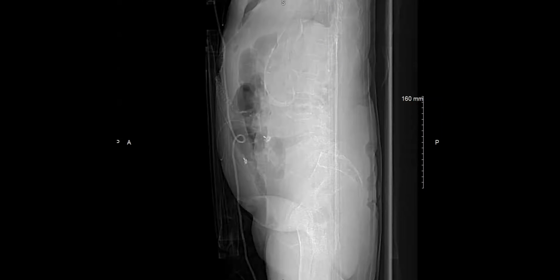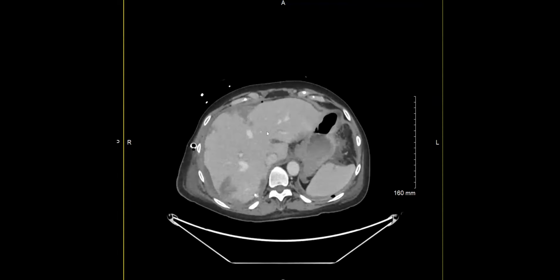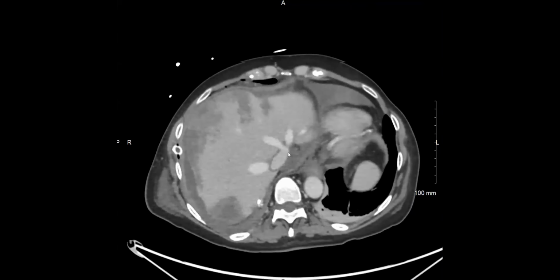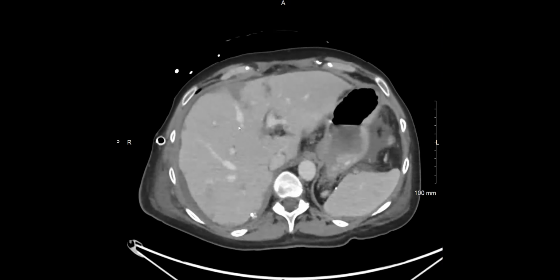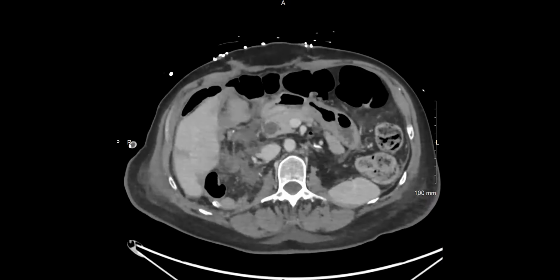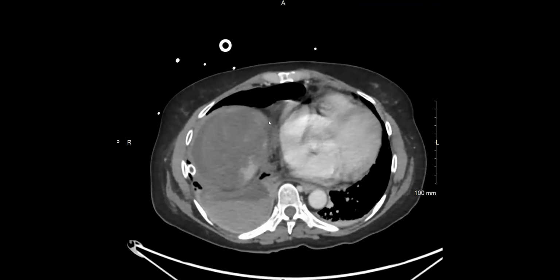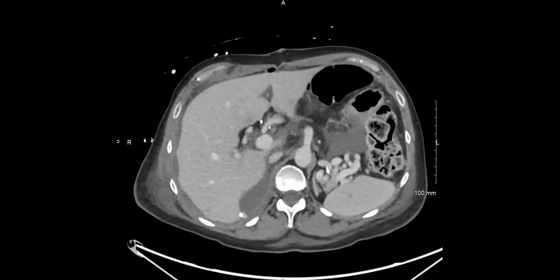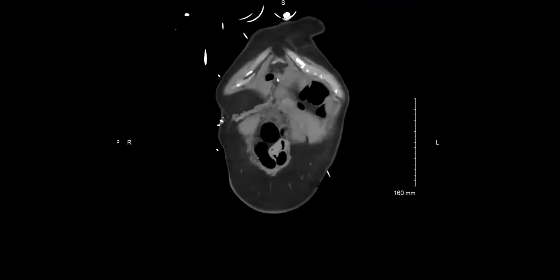Okay, cool. All right, so this is a patient who just had a liver transplant and is in the SICU, presenting with a rising lactate. And this is the scan. It's not a diagnostic dilemma, right? It's not an eyesight test. This is the graft, and you can see that there are multiple large areas of complete non-enhancement within the parenchyma. And these are infarcts, even though the vessels in this patient were completely patent.